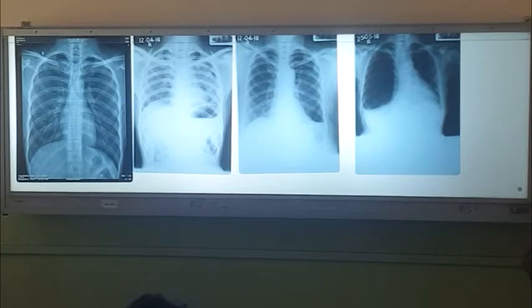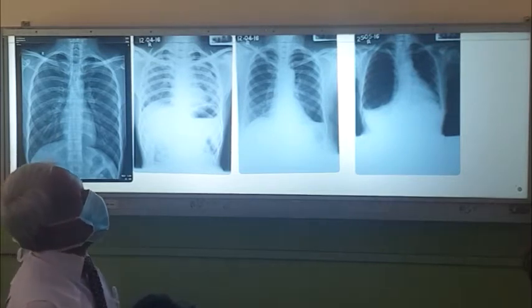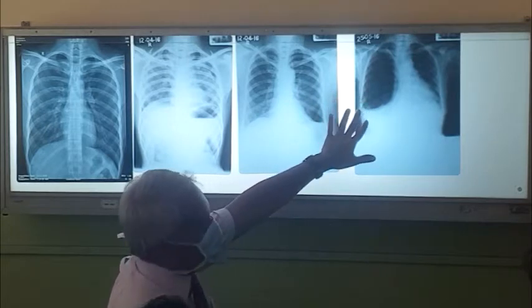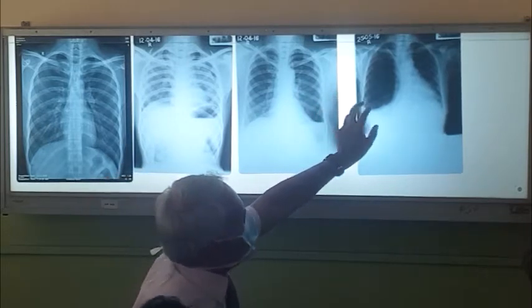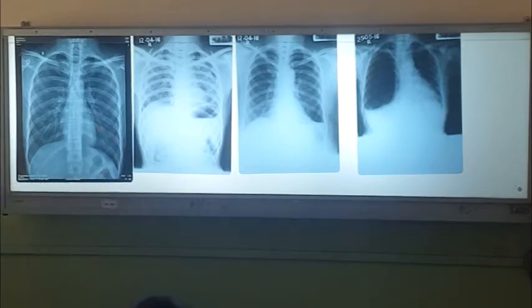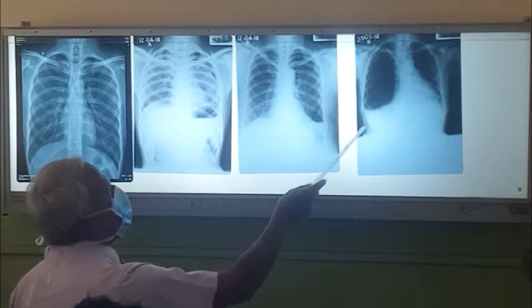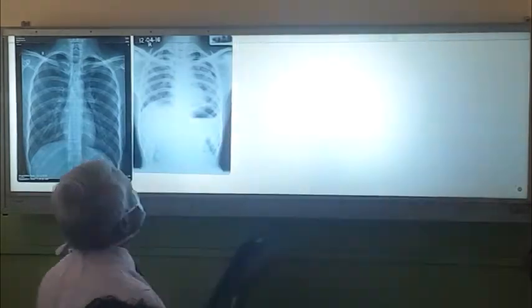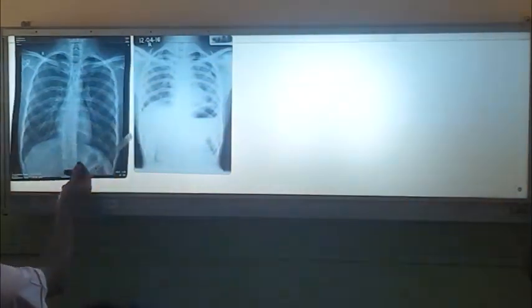But it is very important to differentiate, because if somebody thinks of pneumothorax here and puts an IC tube, this patient is going to die, right? You get a severe bronchopleural fistula and he is going to die, right? Whereas if it's a big pneumothorax, if you don't put an IC tube, he is also going to die, right? Sometimes you may have to do CT to differentiate, right?